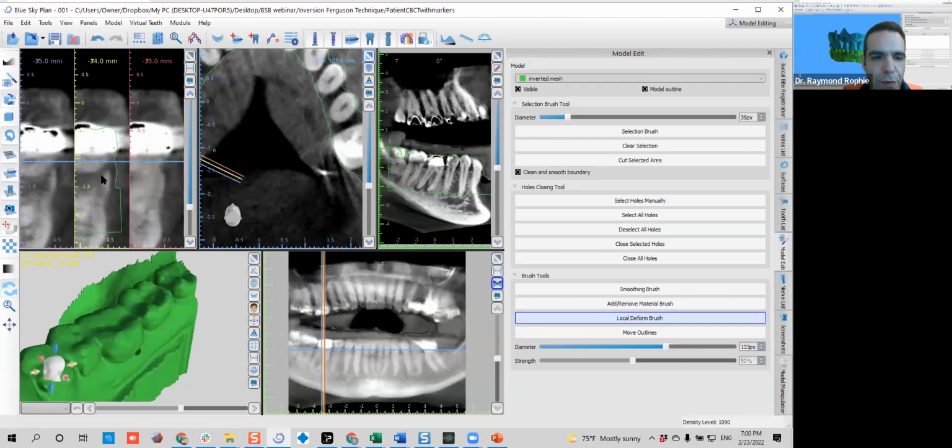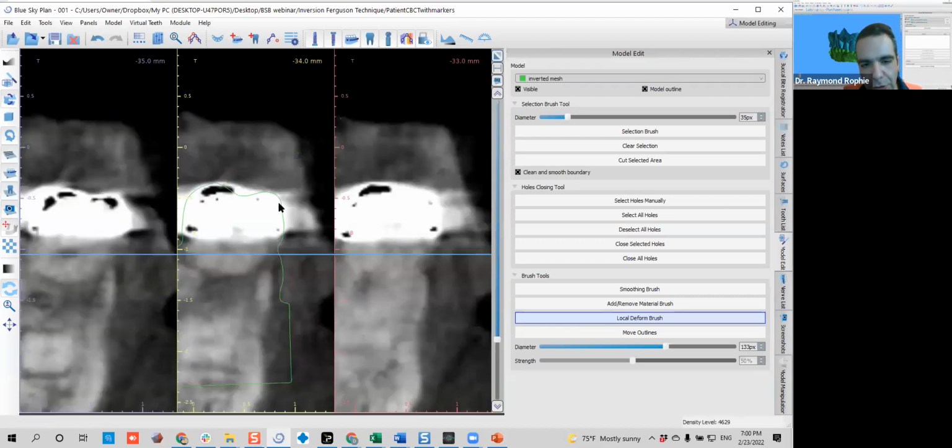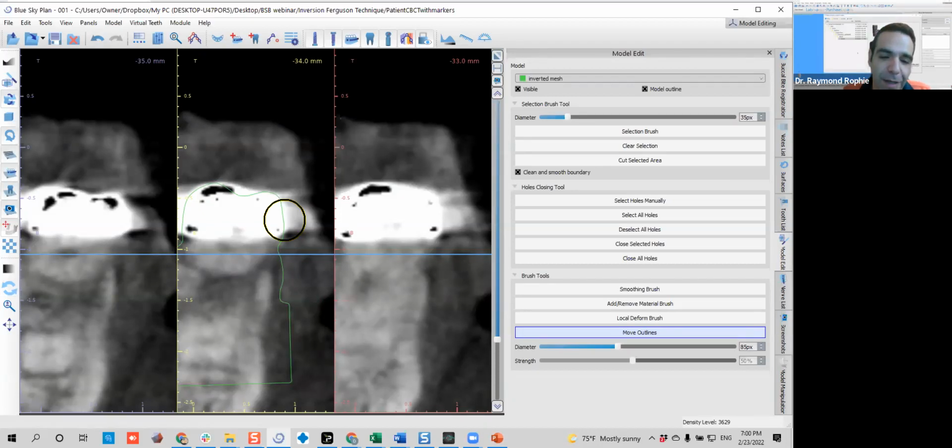Okay, so if you're going to use your guide right there, and for example, this model is showing you that it will impinge the crown with what I did, you can use this other tool. Pay attention, please hold on, bear with me, because these are all tools that nobody knows, that nobody explains, or they're not explained well.